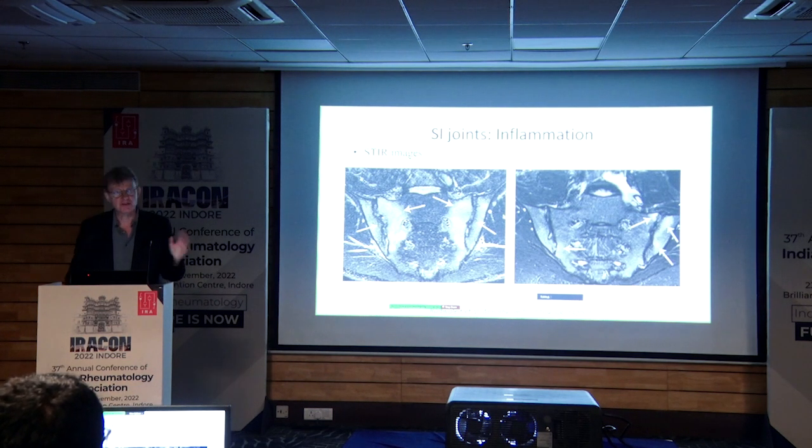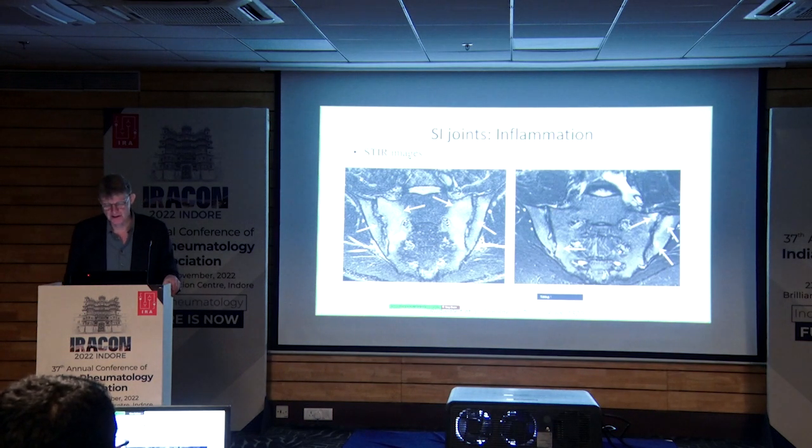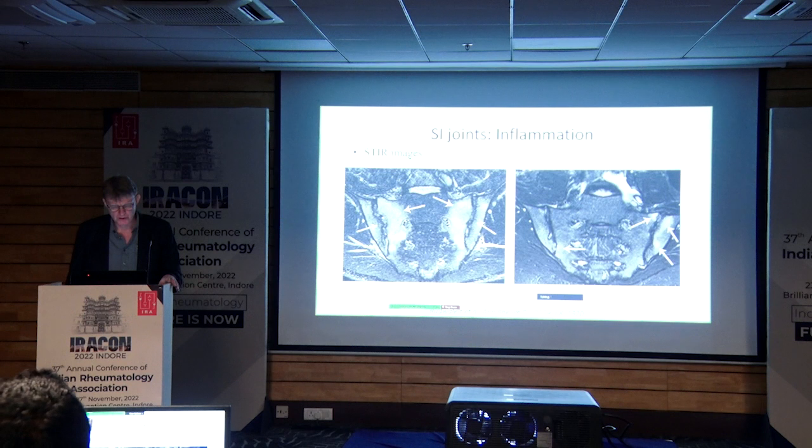Sometimes you will also see other signs of inflammation, but they're not as important. One of them is this thing that you have a line crossing here, which may be a little bit brighter. That's capsulitis. The capsule is seen here. It could also be down here. The capsule is here, and that can be inflamed in spondyloarthritis. This we see, but if we see a lot of inflammation up here in the soft tissues or out here outside the joint, then it suggests that it's a septic or infectious disease, which is characterized by spreading into the soft tissues. I'll come back to that. That's one type of images where water is bright here. You'll also see that the water inside the disc here lights up, and the normal discs have water inside it, and they are bright.